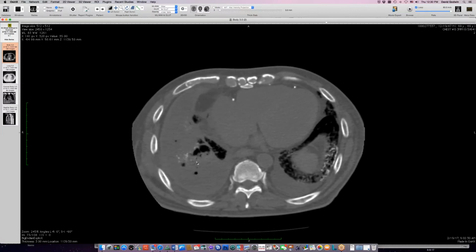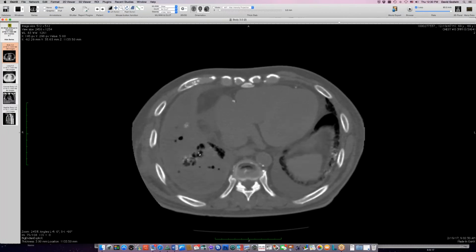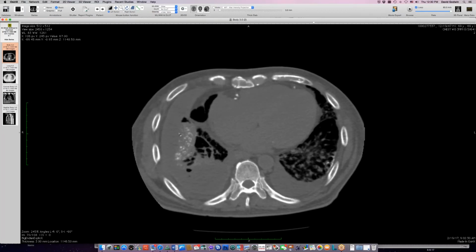So another component of calcification in tissues where it doesn't belong. This really looks like pulmonary ossification. We don't have any biopsies of the lung to see that this is bone and not just calcium. But these uniform little spots in this particular subpleural basal location are very good for DPO as a component in this person with this widespread abnormal calcification. So tumoral calcinosis and presumably DPO.